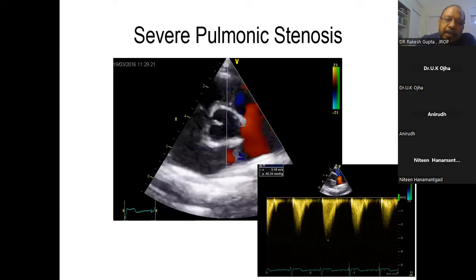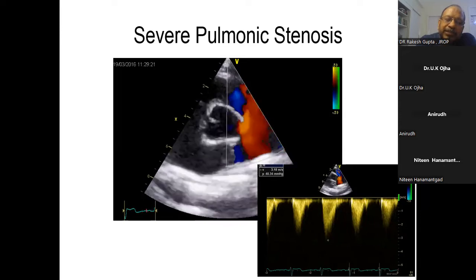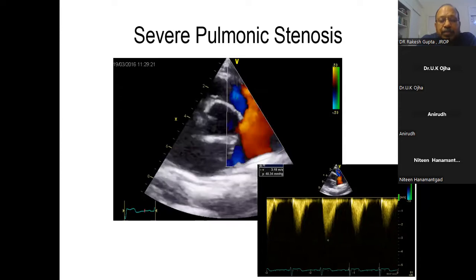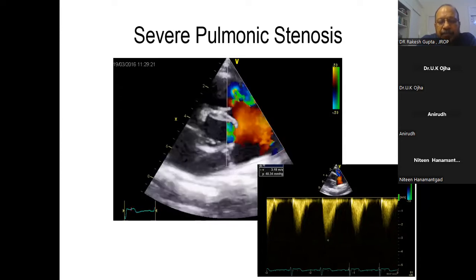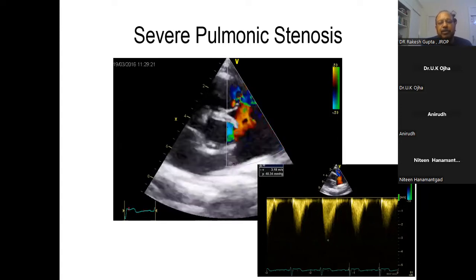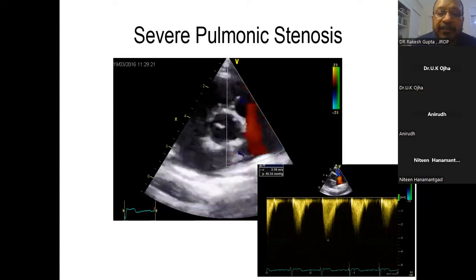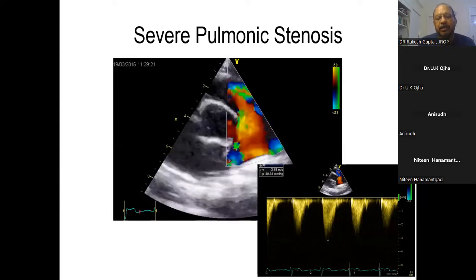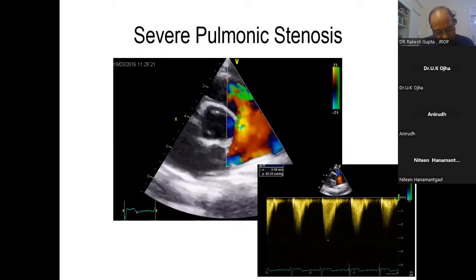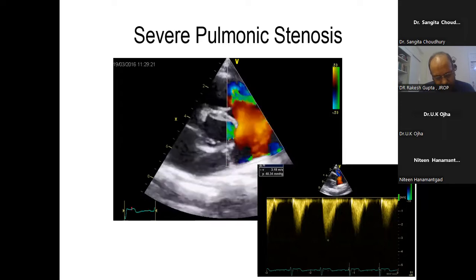The highest RVOT diameter is 2.6, 2.7 centimeters. So in the true sense, it is always bigger than the LVOT. Yes, sir, it looks like that, that's why I asked. Whenever the cutoff comes to more than 2.7 for the pulmonic valve, then we start saying the pulmonic artery is dilated. So RVOT and pulmonic artery diameters, RVOT would be larger than the pulmonary artery, sir.